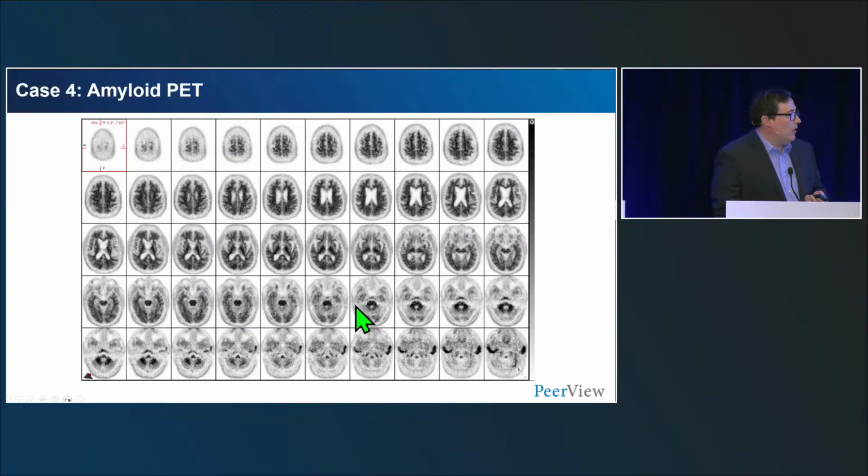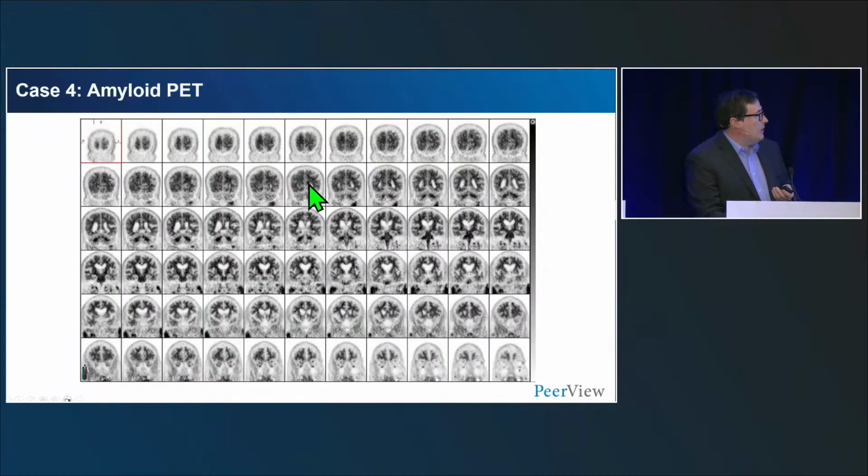If we kind of get our eye set for gray-white differentiation, I would argue that in regions in the occipital cortex, particularly here kind of right medial, there's reduced gray-white contrast on multiple cuts. I think also there's some generally reduced gray-white contrast in the parietal cortex, but this is a subtle case. But I think this is visually positive, and you can contrast the posterior distribution of gray-white contrast to the frontal, which I think is clearly different. So I would interpret this as visually positive.